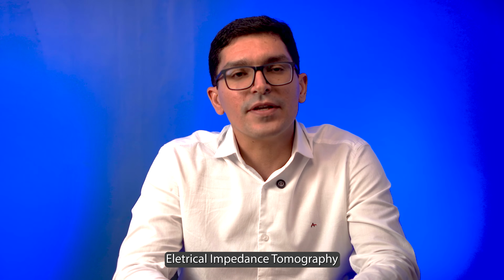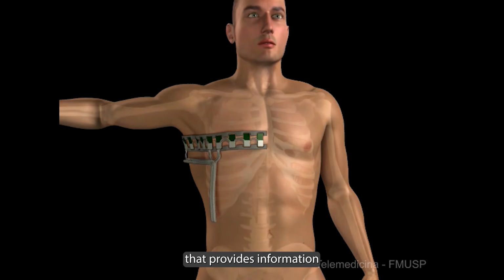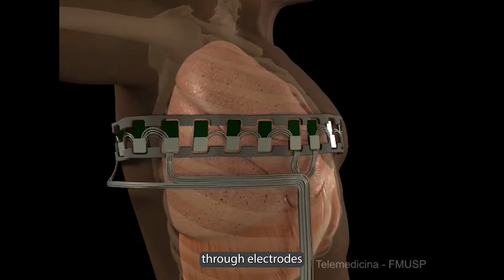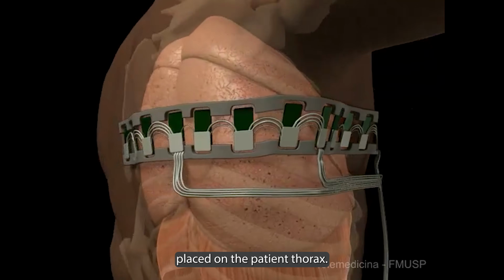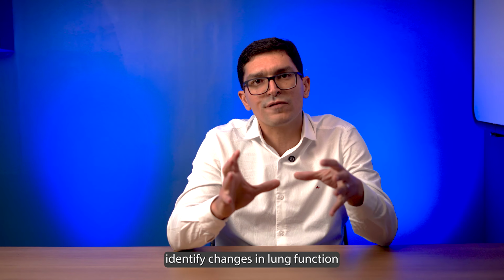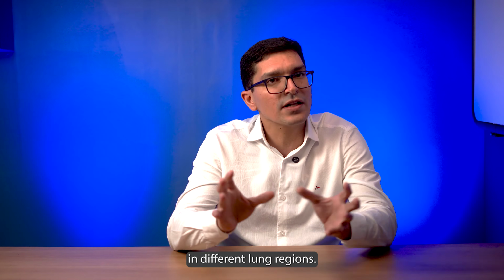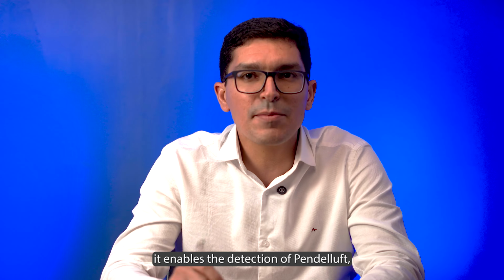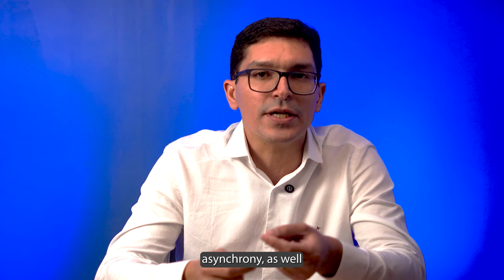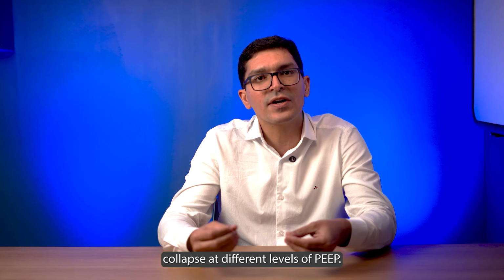Electrical impedance tomography is a non-invasive, radiation-free medical technology that provides information about regional distribution of ventilation through electrodes placed on the patient thorax. With EIT, we can precisely identify changes in lung morphology and function and measure a variety of physiological variables in different lung regions. For example, it enables the detection of pendelluft, an important type of intrapulmonary asynchrony, as well as the monitoring of lung overdistension and recruitable collapse at different levels of PEEP.